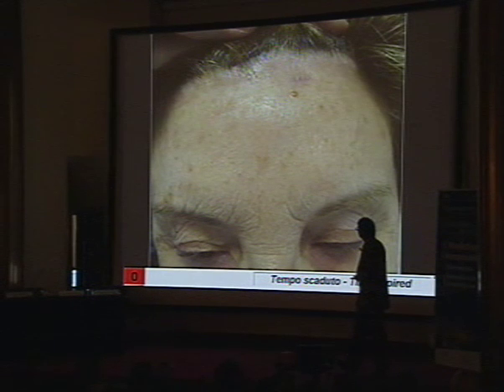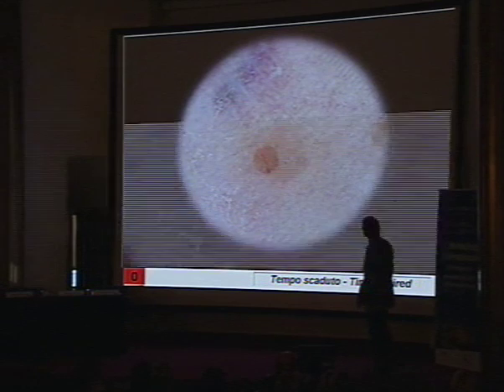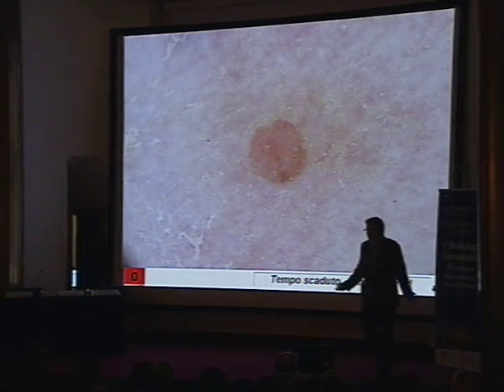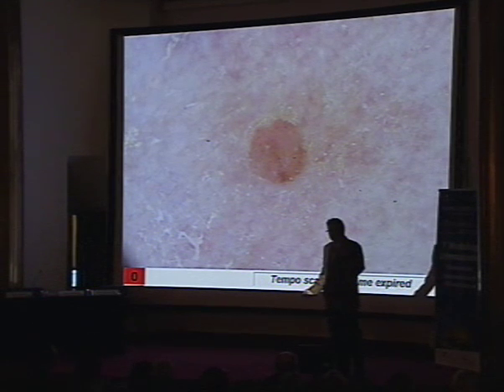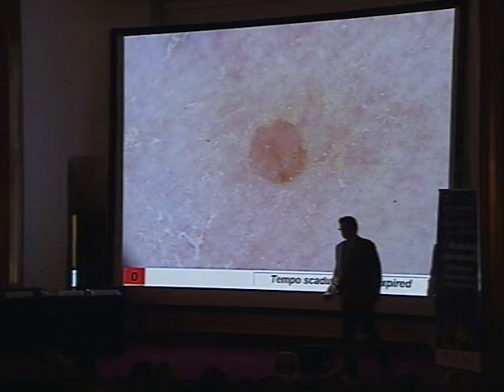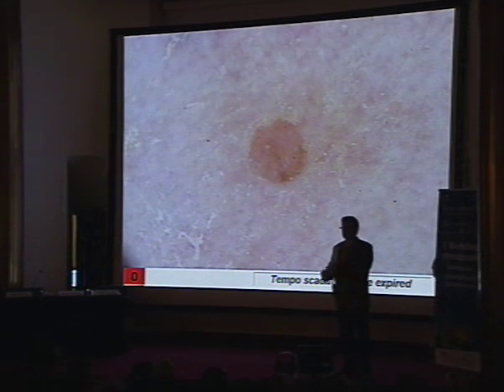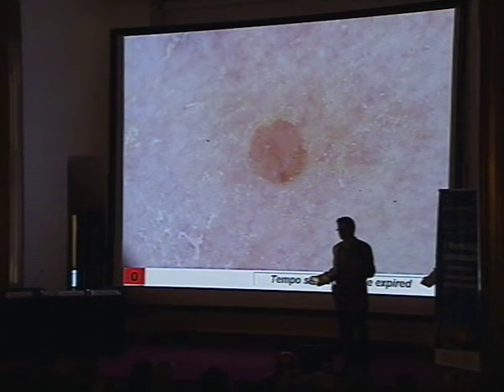What is this? Okay, this lesion. Go into dermoscopy. Not much. And if you tell me, what do you think? Maybe this could be comma vessels, I don't know. But it's a strange thing. Of course, it's a growing lesion, a fast-growing lesion. It has to be something else, and we have to remove this tumor.